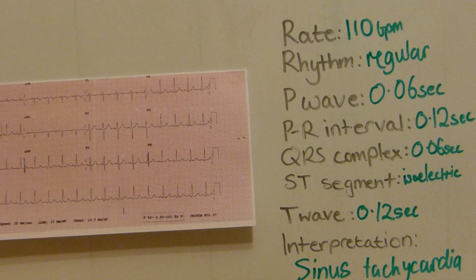This systematic approach can be done to any ECG and is a great way to approach any ECG when attempting to interpret it.